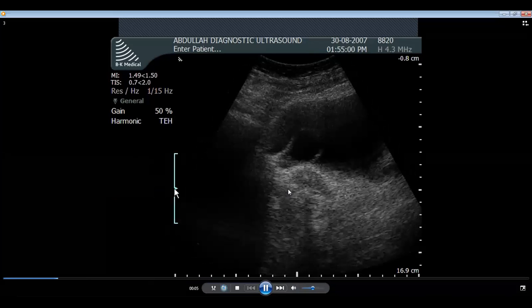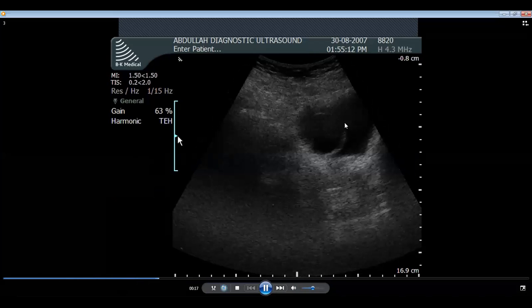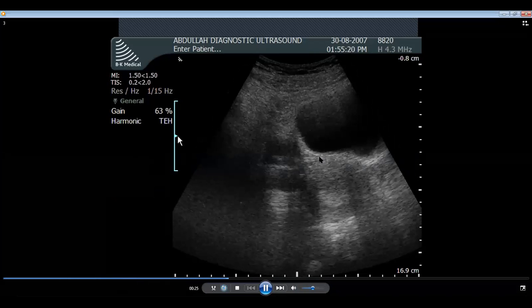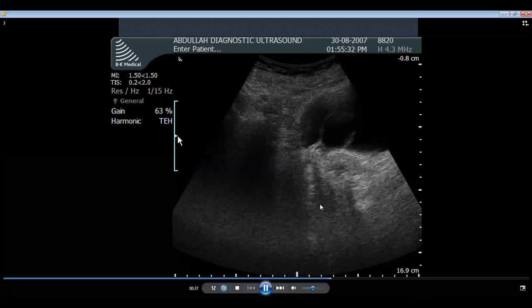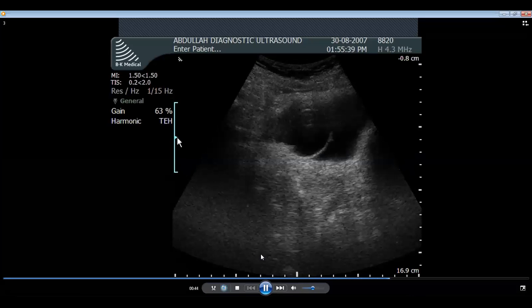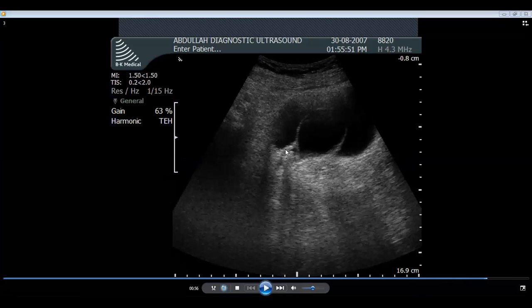Now, in this image, the distal end of the right ureter is herniating. The ureter is herniating into the bladder like a balloon. Herniation of the distal end of the right ureter in the bladder is seen here, which is herniating into the bladder as a balloon. There we are. And here, impacted in the neck of this balloon, is a calculus producing a shadow. A clear cut shadow can be seen. There we are. A stone impacted here in the neck of this balloon, producing a shadow.